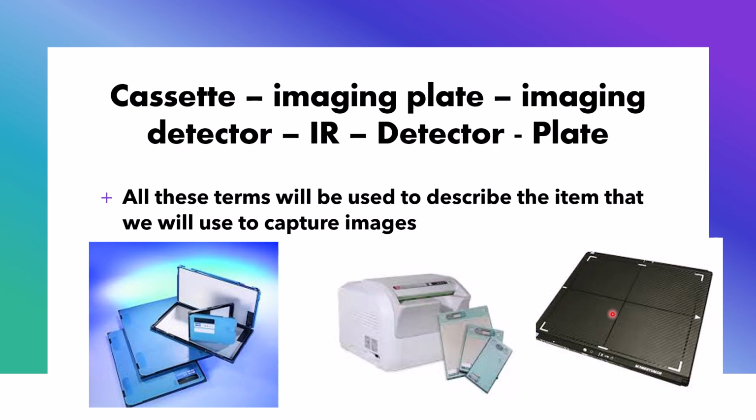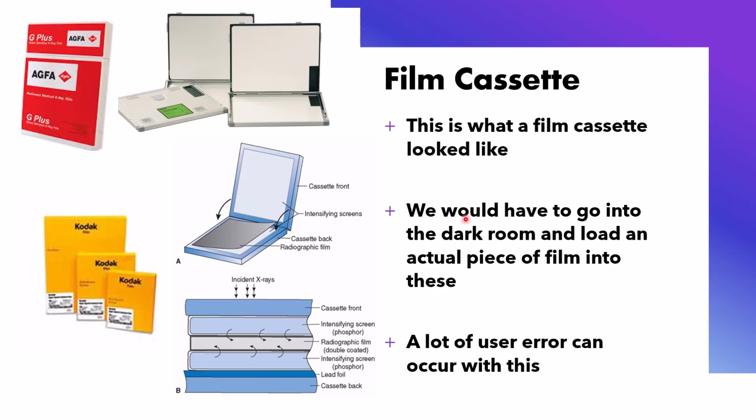And this is the DR plate, which we use when we make an exposure. You do not have to do anything. It automatically sends the information to whatever receiver you have, usually a computer, but it could also send it directly to a portable X-ray machine, or some viewing screen that is connected to it, and the connection is usually Wi-Fi.